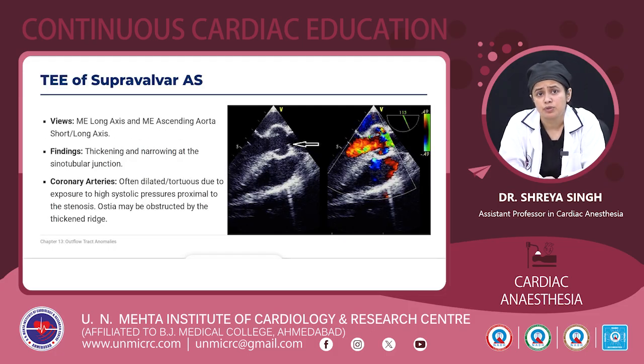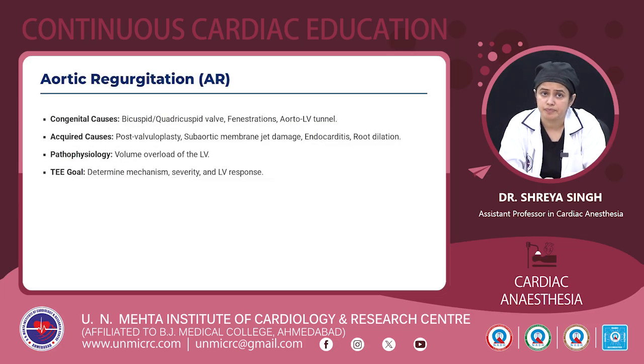On TEE, the views used are mid-esophageal long axis and mid-esophageal ascending aortic, short or long axis. We can see thickening and narrowing at the sinotubular junction, and the coronary arteries often get dilated or tortuous due to exposure to high systolic pressures proximal to the stenosis. The ostia may also be obstructed by the thickened ridge.